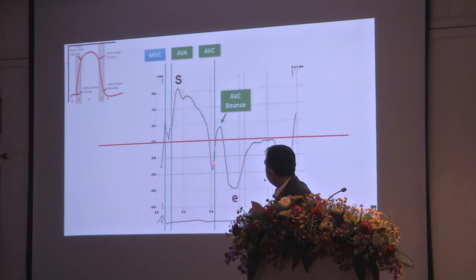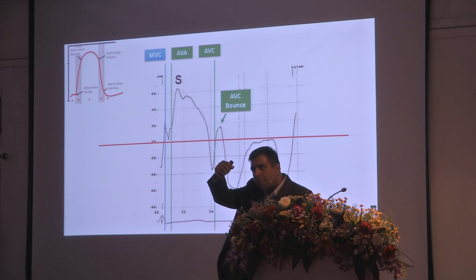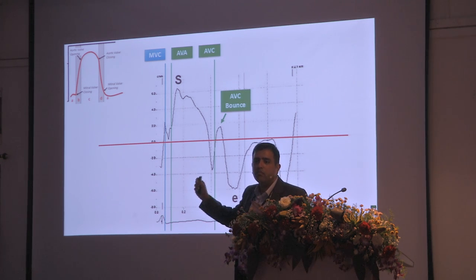So back to our figure over here, this negative spike is because of that systolic notch, because of the fact that there is a negative pull of the epicardium that is taking place at the end of that aortic valve closure. So we have aortic valve opening, which is the start of that limb. The limb extends down and you have a negative part. You have a relaxation part taking place within the systole. And this was, hey, how can you have relaxation taking place during systole? The relaxation is because of that epicardium, which is actually elongating, actually relaxing at the end of systole. And the end of that negative spike is where the aortic valve closes.